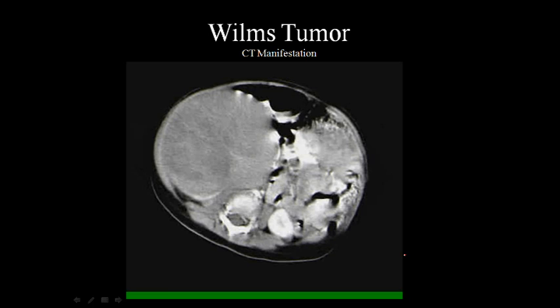So here we have a young patient. We have a kidney here. We have what looks to be bowel content here. It looks like there's some degree of motion throughout in all of these areas. And I noticed that the patient is kind of laying not flat, not decubitus either, but kind of at an oblique angle. But that's neither here nor there, because we see this large area here.